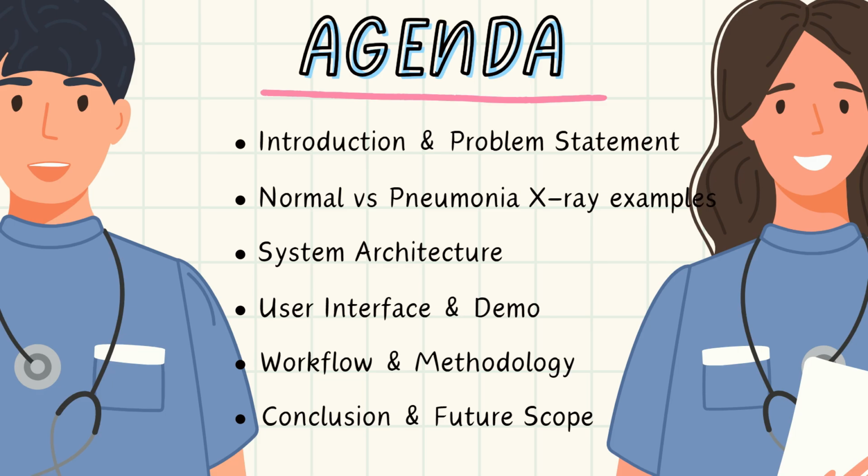After that comes the exciting part, a live demo, where you will see multiple AI models in action, including one that actually visualizes the infected area. Then I will explain how we built it, the workflow, the models we trained, and their performance. And finally, where we are taking this project next. Let's jump into the problem.